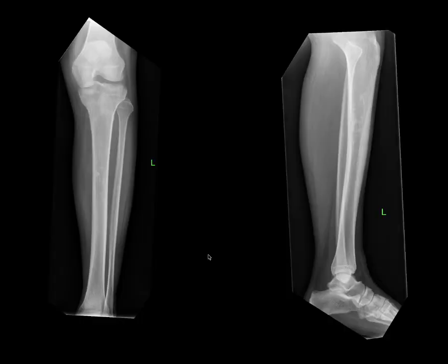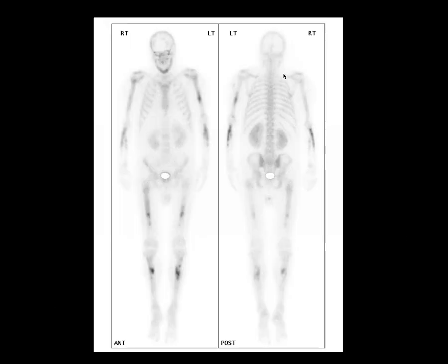We did a few x-rays on the patient, and you can see some sclerosis here in the tibia, and this area was felt to be the most appropriate site for a biopsy to see what was going on, and they did have a biopsy of this area using CT, and it actually grew E. coli. So this patient had E. coli osteomyelitis, which is quite unusual, but of course any organism can occur in a very immunocompromised patient.